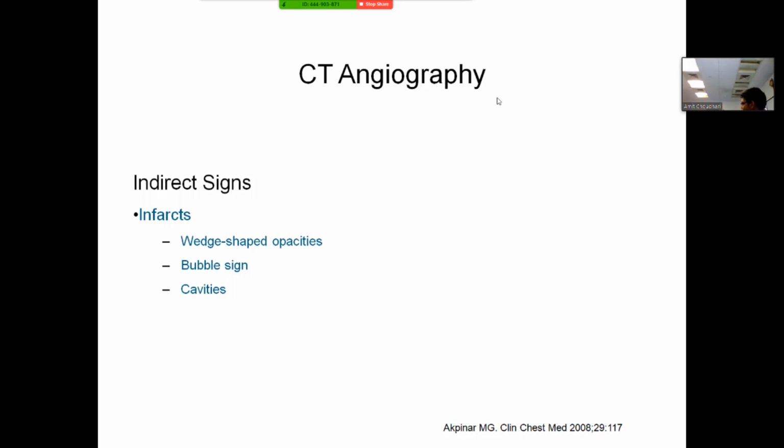Mosaic and infarction. So mosaic will come into the chronic phase. So what are the things that will come into the acute phase? Infarct. And pleural effusion. Okay. Lesions will be relatively later. Bubble. So this kind of bubble you will see in both adenocarcinomas and this one. You can see this bubble sign.